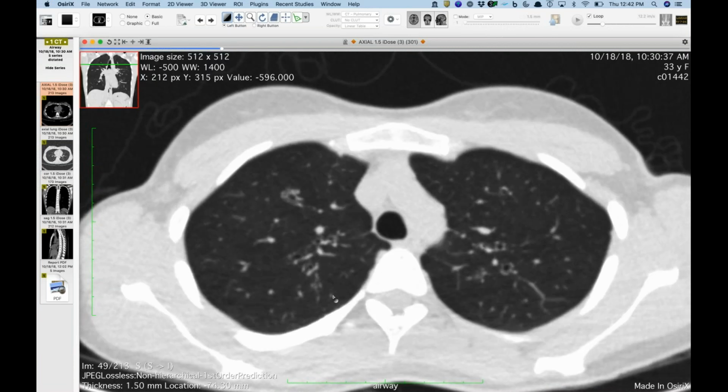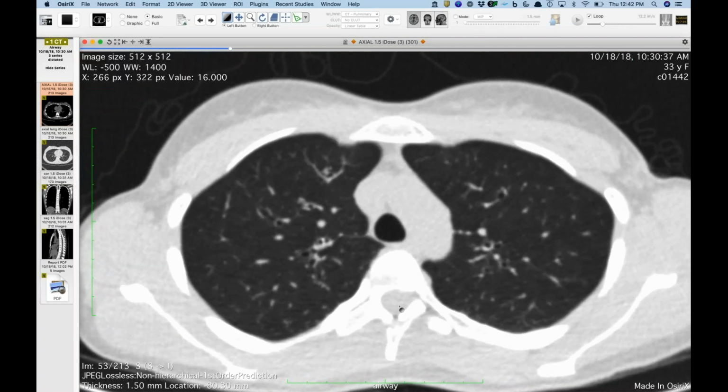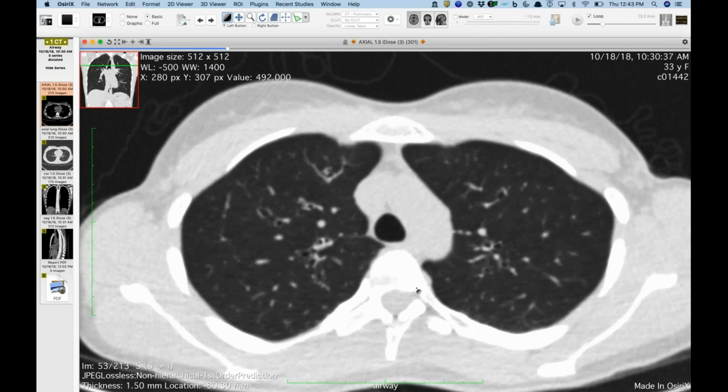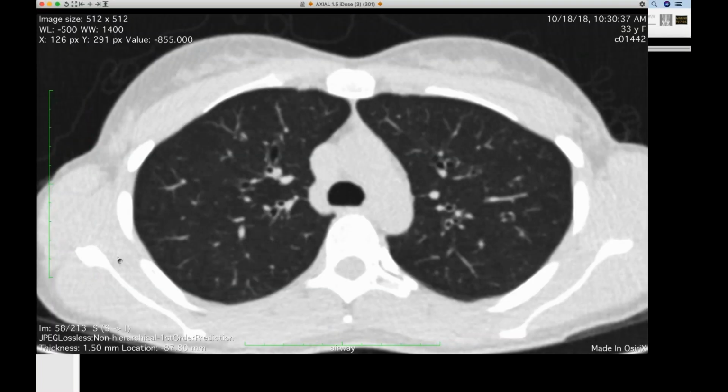Well, yeah, I was wondering about GPA until you mentioned the asthma component, but I don't think I've seen EGPA cause large airway disease like this. We've seen a couple of cases of bronchiectasis, but it was more focal with EGPA, and I was never sure if it was actually the EGPA or some concomitant pneumonia that just injured a specific portion of lung.